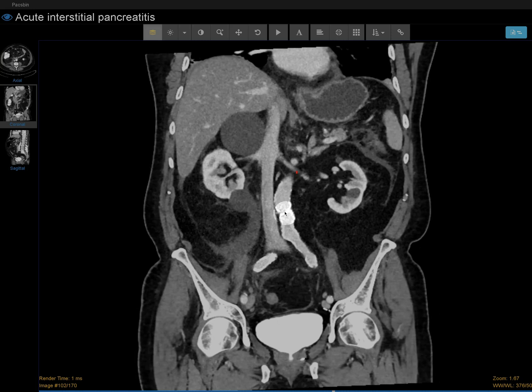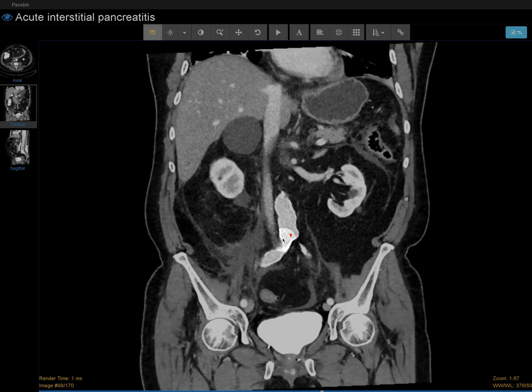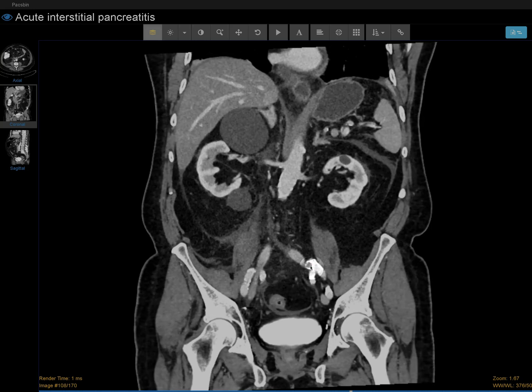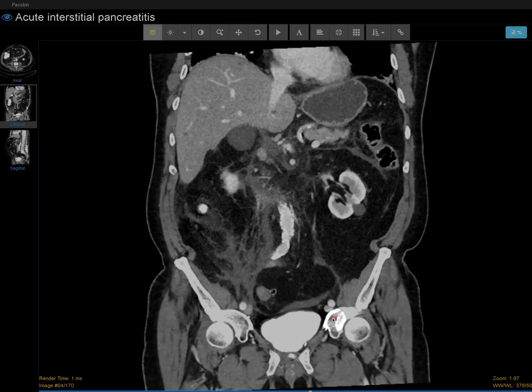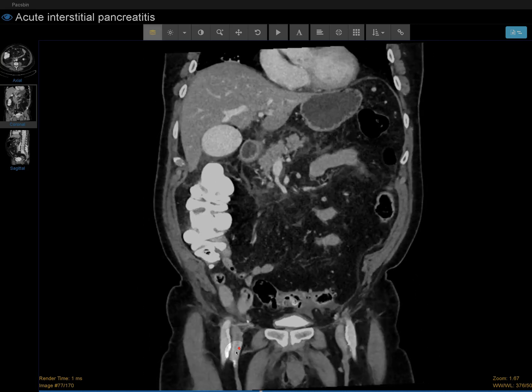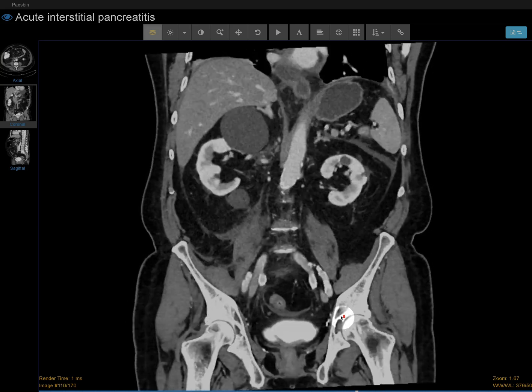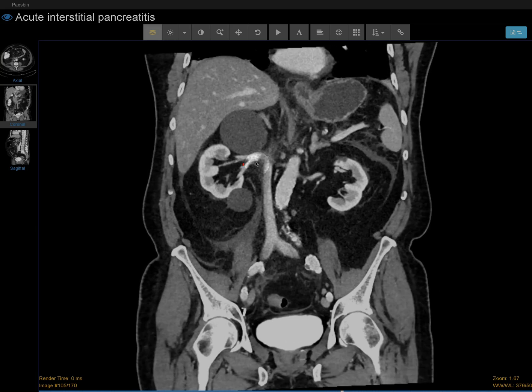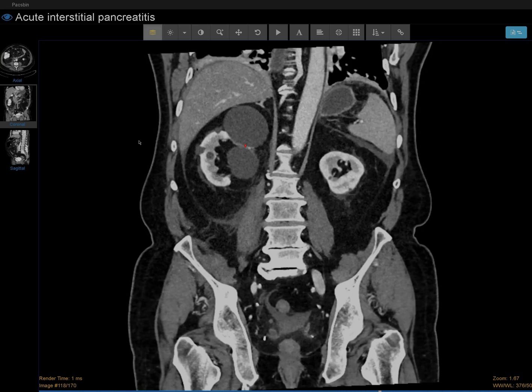So aorta, there's some ectasia of the infrarenal abdominal aorta, a lot of arteriosclerotic calcifications, no aneurysm. Similarly, ectasia of the right common iliac artery, left common iliac artery. There's a small mural thrombus here. It's diffusely calcified blood vessels. And then we can follow the veins as well. Nothing that resembles a thrombus: right renal vein, left renal vein, right renal artery, left renal artery.